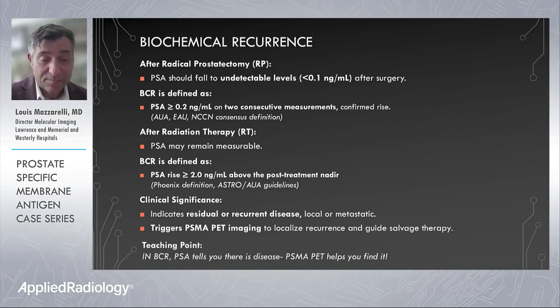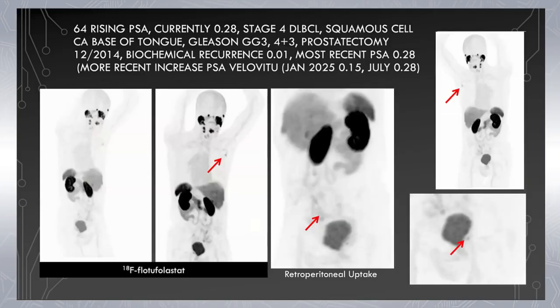In BCR, this is our teaching point: PSA tells you that there is disease. PSMA PET helps you find it. So let's look at a case.